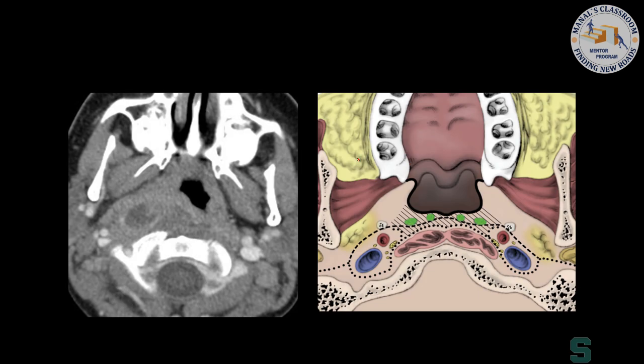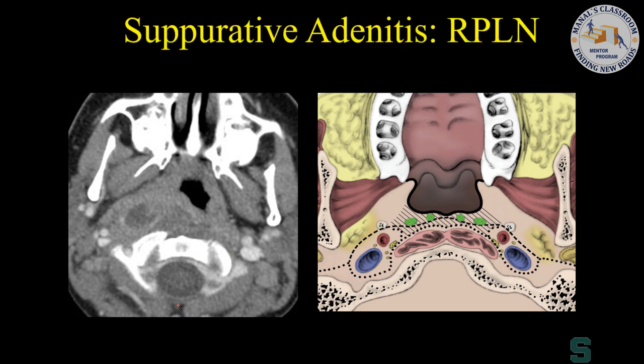Now I showed this case before. I want to see how good your memory is. What's the diagnosis here? How many people say retropharyngeal abscess? Okay. How many people say suppurative lymphadenitis? Okay. And the answer is suppurative lymphadenitis, right?